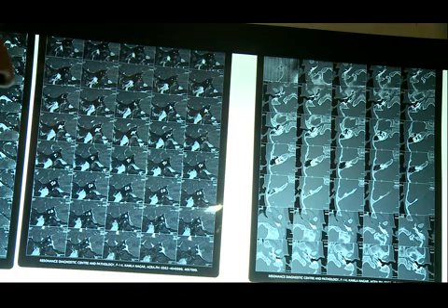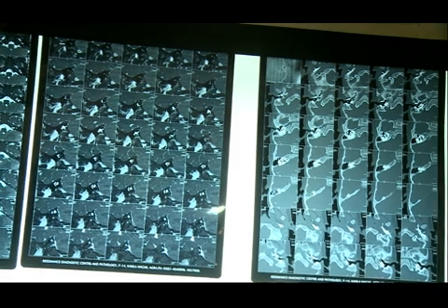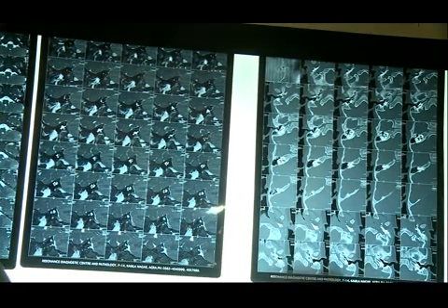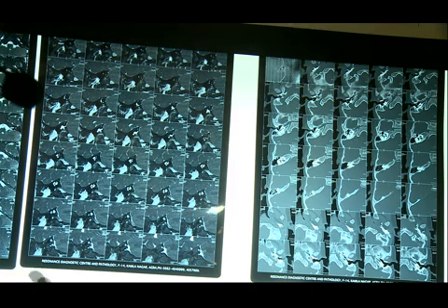This has to be handled in a very different way: the cochlear nerve presence, absence or deficiency, and accordingly the patient should be treated. But yes, if the internal auditory meatus dimension is less than 3 millimeter, that warns you that the patient may have a cochlear nerve deficiency. Normal dimension doesn't have any role with the cochlear nerve dimensions.